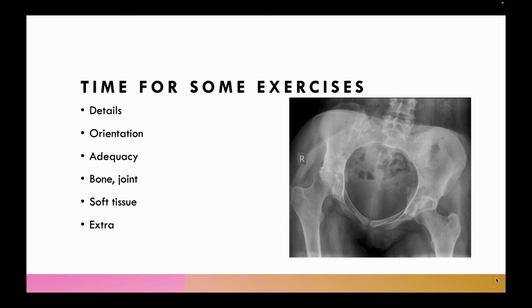You can practice with more radiographs, and once you keep on doing this, you will be fluent in this description.